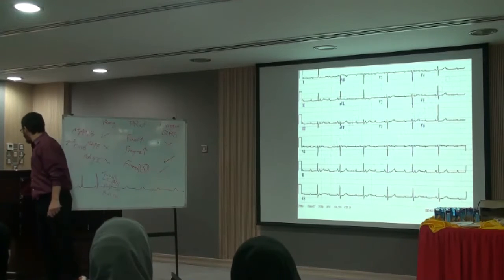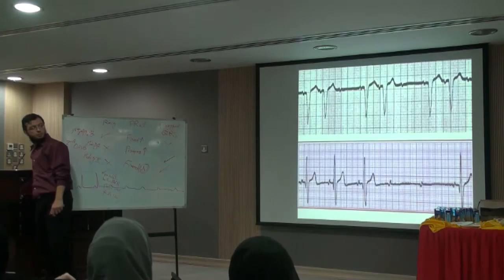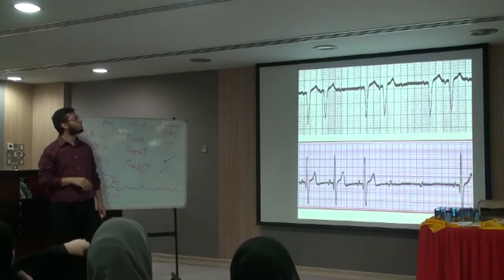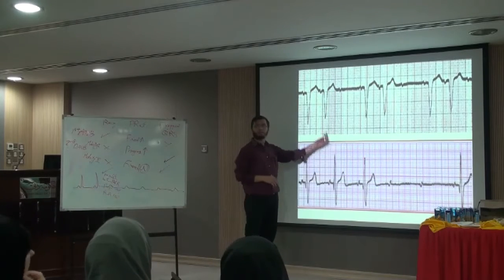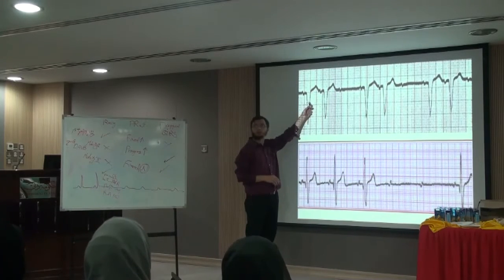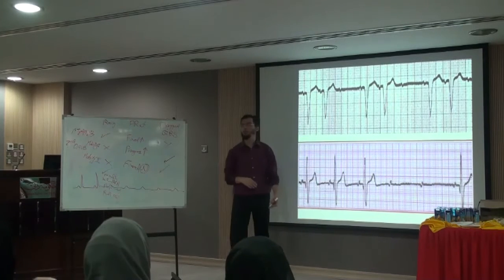Second degree AV block can also be wide complex. It's not a must to be always narrow complex. Why?